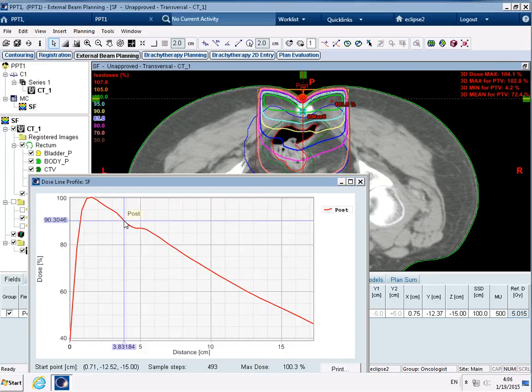So I want you to have a go at measuring Dmax along the beam and see what that shows us on this depth dose curve. We know at 6 MV the Dmax is approximately the energy divided by 4, so we would expect it to be 1.5, depending on how accurate we can pop this line on here, but yeah, we can see there, can't we? And equally we could work out these different points along here and calculate what they are.